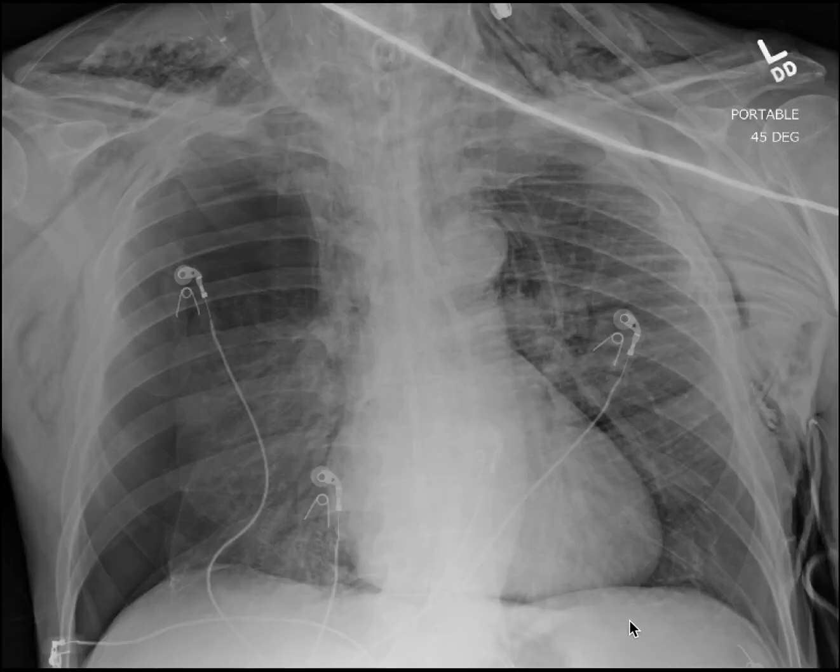All right, now let's look at big things. Let's start by looking at this side. This is the patient's right side. Right off the bat, you have to make this diagnosis. This is a pneumothorax and is a very large one. You can actually see that this line here is the lung line. You could trace it up here. This is the lung being smashed by air in the pleural space that does not belong here. That's what a pneumothorax is.